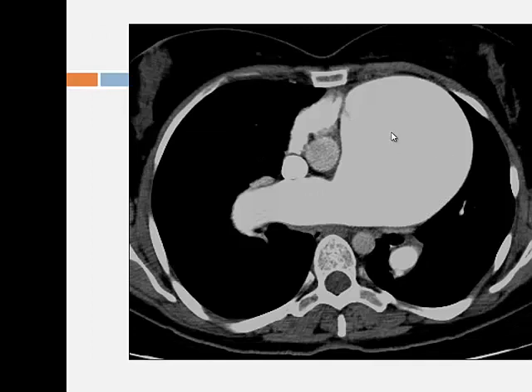Okay, pulmonary arteries can get absolutely massive. You'd be surprised at some of the pulmonary arterial hypertension cases. I think one lady has something like a 9 or 10 centimeter pulmonary artery, so they're massive. The weird thing is, as they dilate to that extent, you can actually get dissection of the pulmonary arteries, which is extremely rare. So it's usually only in these sorts of cases that you'll ever see that. But that can, unfortunately, be a cause of sudden deterioration.